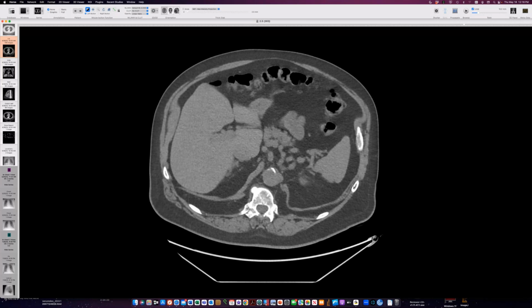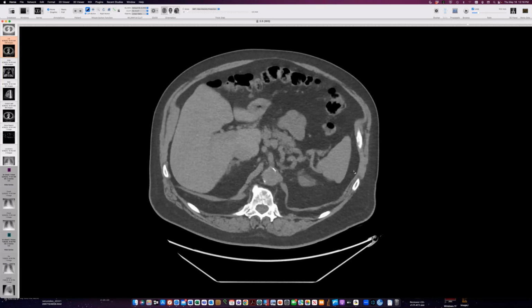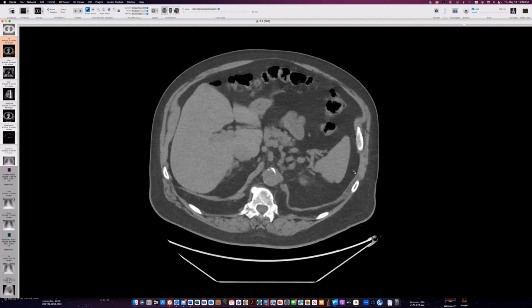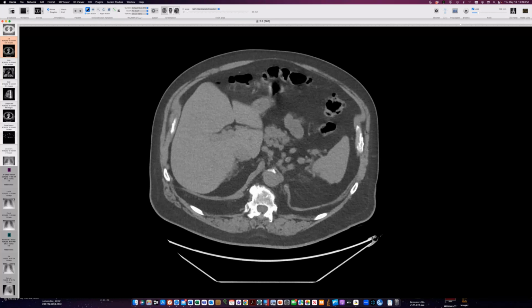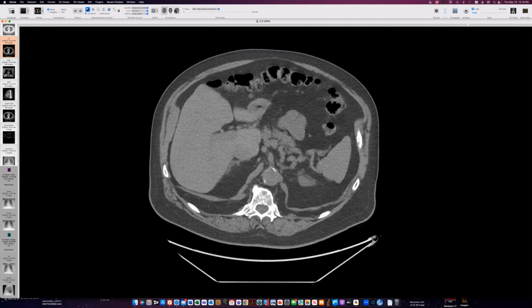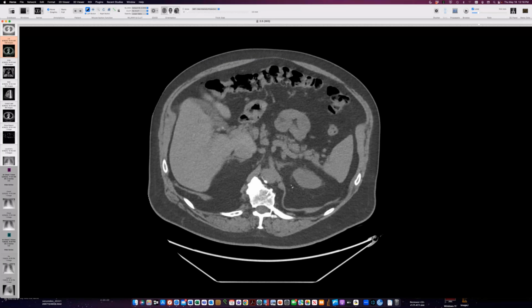And yet these hernias that we see in adults, and we see them with increasing frequency in age, are clearly acquired. These are not congenital hernias, and they tend to be medial. You can see this one is very medial. So they're posteromedial. They're back in here or in here, something like this. And they're not way out in that lateral location that's the well-described Bochdalek. So I have a feeling that what we're calling Bochdalek hernias these days, because we're picking them up in asymptomatic older adults who are getting CT scans for other reasons, is not really the same thing that Bochdalek had in mind with the big posterolateral left hernia.